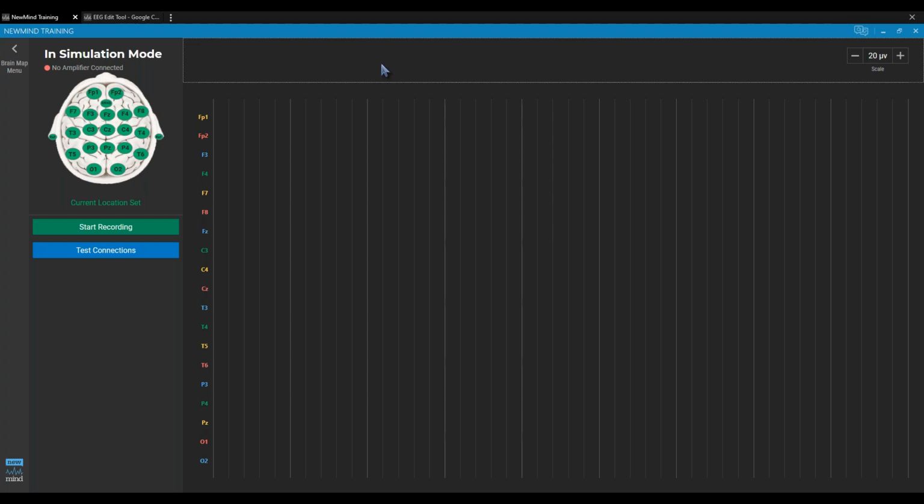Once the timer starts, you're pretty much committed at that point to recording all the way through to the end. We do have a stop recording button, but if I click stop and then confirm, that data is gone. It does not get saved. The software just throws it away and there's nothing left.